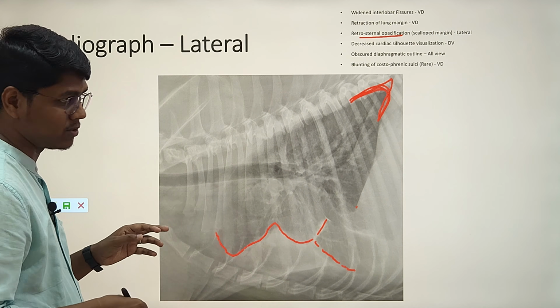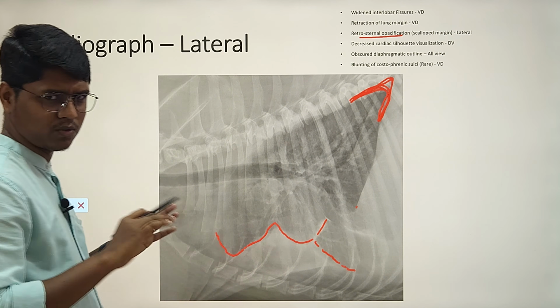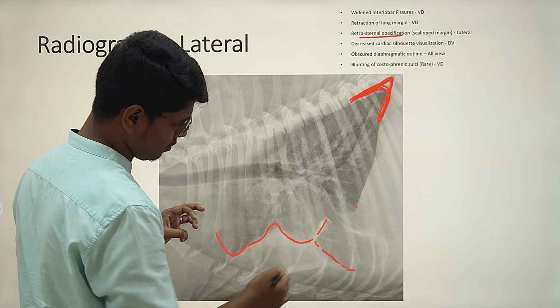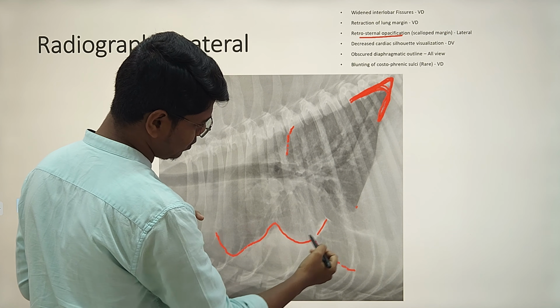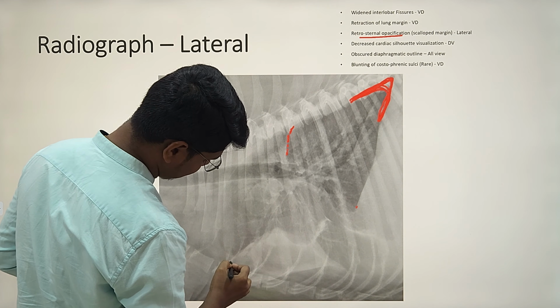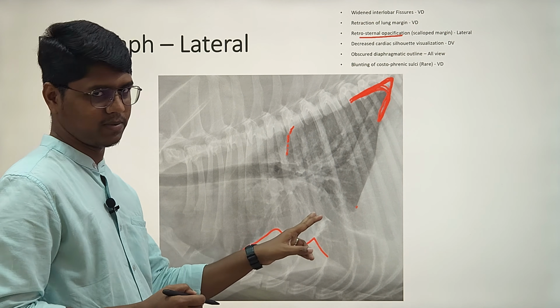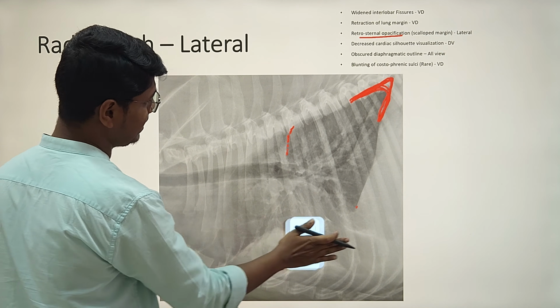Okay, we'll see some radiographs also. Before that, I am telling you that this is the normal appearance in pleural effusion with no lung pathology. You may see that it is of triangular shape. Can you identify any fissures? One I told you here, one is here. Many times this is confused with the heart actually. Okay, so this margin is scalloped. You can see that it is curved. So this is scalloped, it means curved, ornamental. This is the scalloped margin you will find in the lateral view.